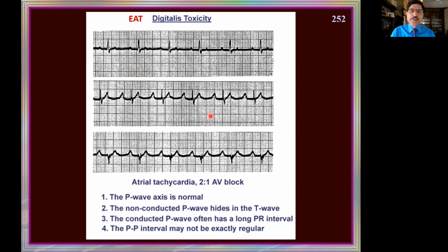So this will tell me that the rate is the P wave rate. We are talking about not the QRS rate. You look at the QRS rate here. 300, 150, 100, around 80. The heart rate is around 80. QRS rate is around 80. Maybe little varying because of this one. But whenever it is conducted, we are seeing almost regular QRS complexes there, and it is around 80.